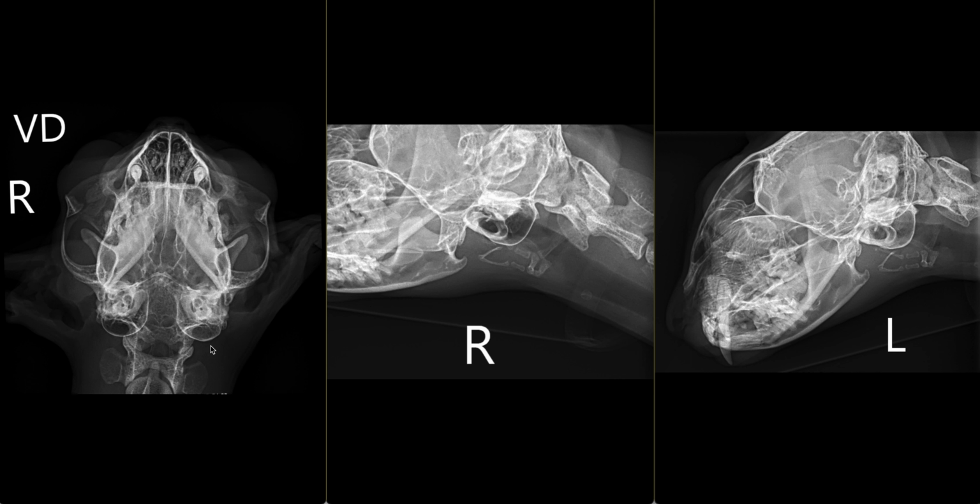The radiographic changes of the left tympanic bulla are concerning for otitis media, as we discussed, especially in light of the patient's pruritic ear, which can represent otitis externa. Without chronicity, radiographic signs might not be evident. A recurrent polyp in the relatively abbreviated time frame would be considered less likely, however, cannot be entirely excluded, especially if the stalk was not removed in its entirety, and this can be a challenging part of this procedure.